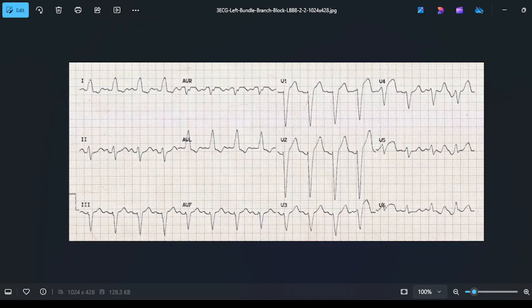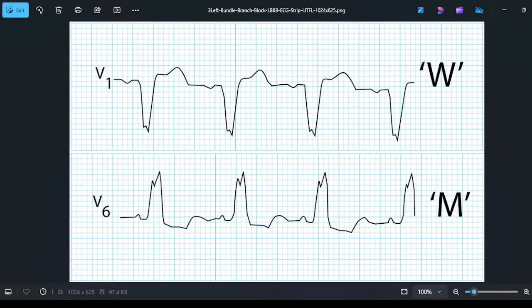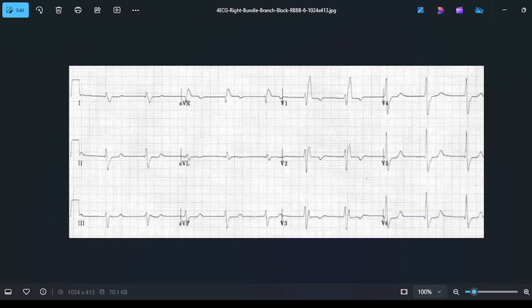See, this one is another one. These are the typical ECGs I have collected, and see again there is no W. You can't see the W here. But then how will you distinguish? This is very wide. This is very wide. This is not normal. See, look at the QRS complex. This is 3 squares, more than 3 squares. In V2, more than 3 squares. Let me show you a normal QRS complex.